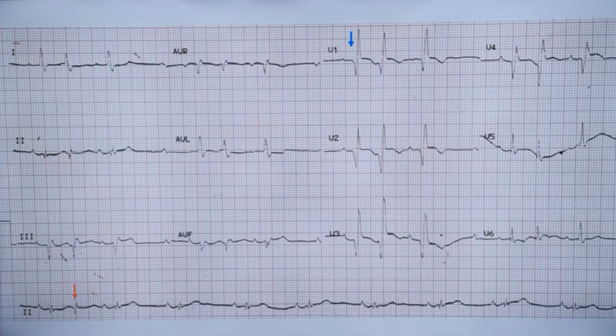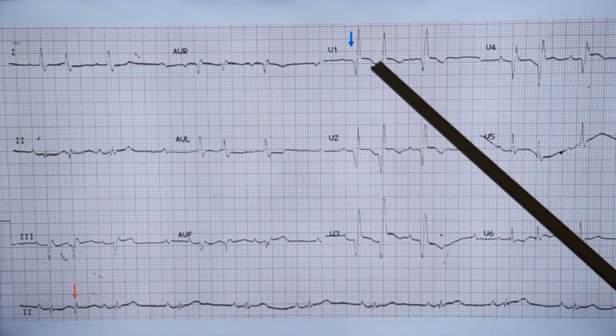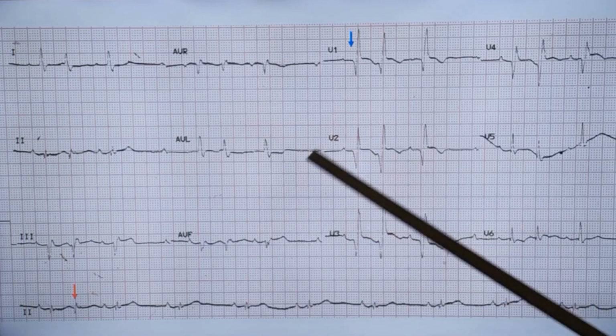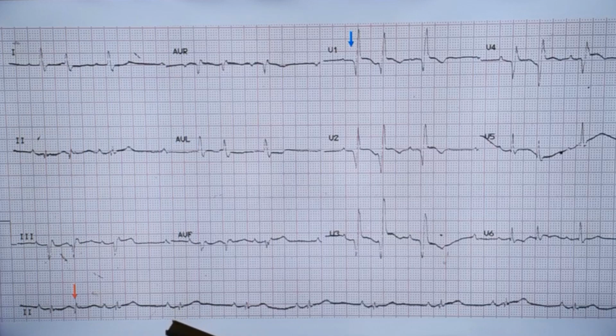So to sum up, this ECG shows basically a sinus bradycardia with occasional supraventricular ectopics and almost trifascicular block, because of right bundle branch block, left anterior hemiblock, and an upper limit of normal or slightly prolonged PR interval indicating trifascicular block. So what remains in this patient is only the left posterior fascicle. If that posterior fascicle is also knocked out by the infarction or another ischemic episode, then this person will go in for a complete heart block.